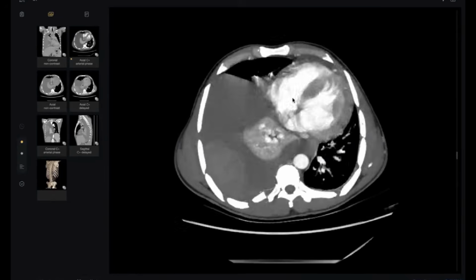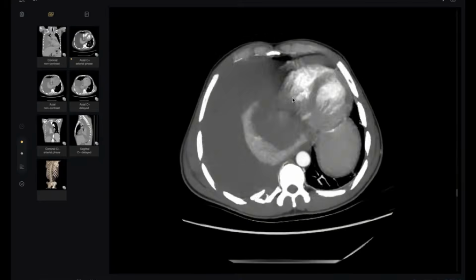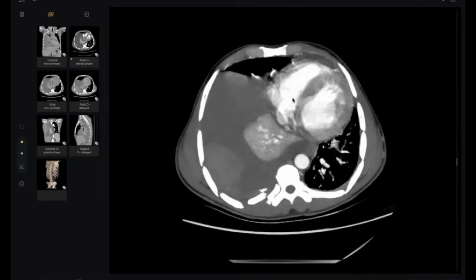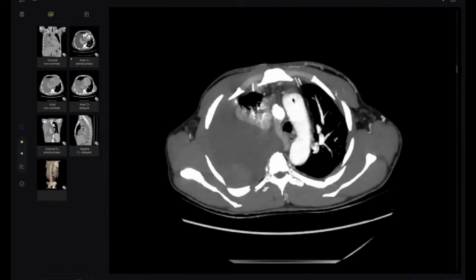This is very important, to tell the examiner the correct name of the technique. Very important. Sure, we need more phases, either CT or conventional angio, to pick up the cause. But at least you did very well when you picked up the diagnosis.